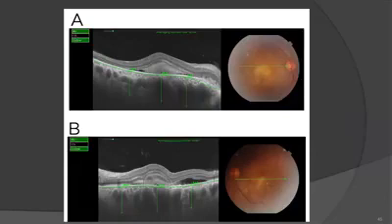So I took the one-line HD image, and I found that there is an increase in the choroidal thickness, which is around 600 here and 613 in the other eye. The question is, what is this case? Is this a case of posterior uveitis or something different?